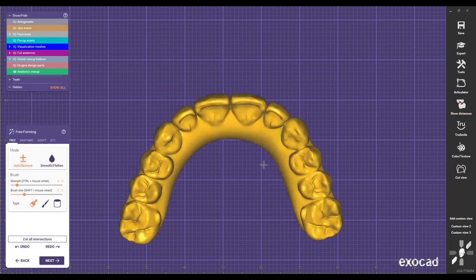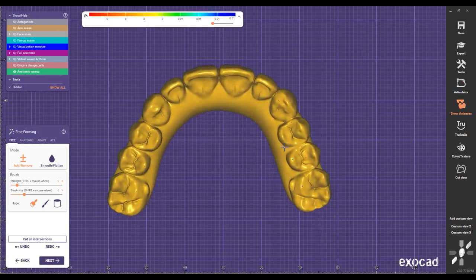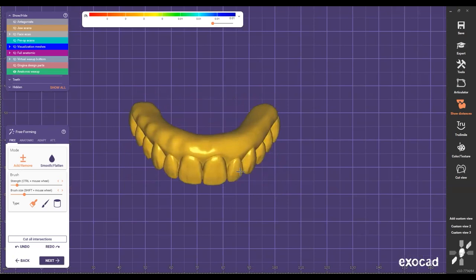So now, once I'm done, I already check the contact points. Everything is just hitting where I want it. So when I do delivery, I want to see the contact point just hitting right on those spots. That's why it's important to understand and learn occlusion, because once you do that, your deliveries are just gonna be spot on in occlusion.